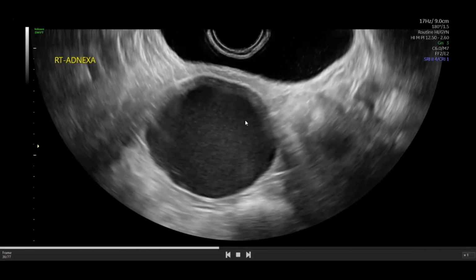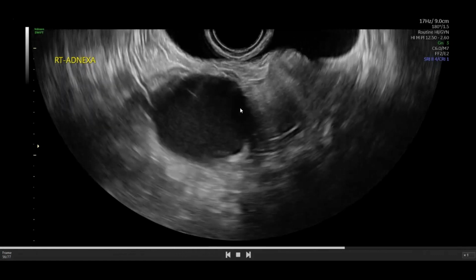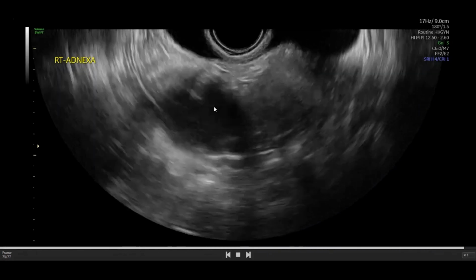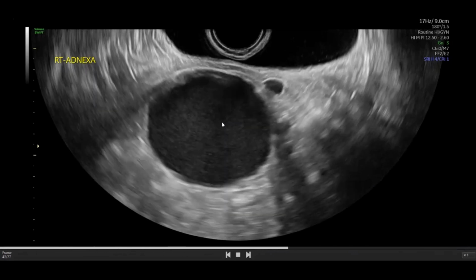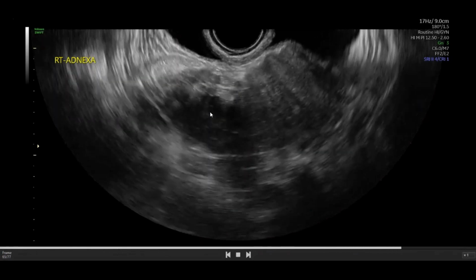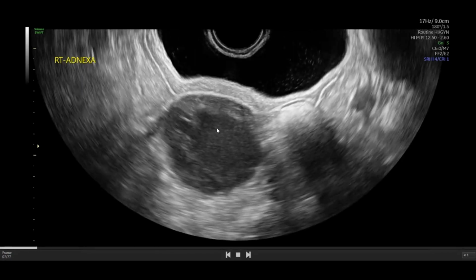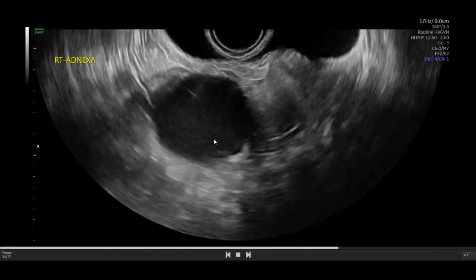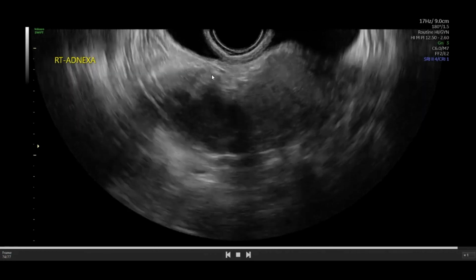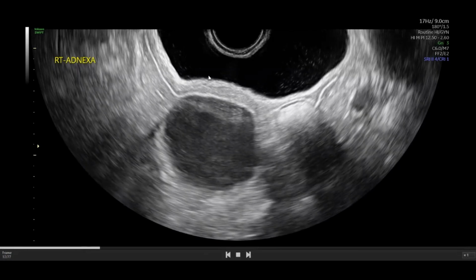And most paratubal cysts don't have contents that have really much substance. They're generally quite serous in nature. They're not like endometriomas, though if you were to absolutely apply the IOTA benign descriptors or easy descriptors to this, you actually might say that based on that, this is an endometrioma. However, we know that this is not part of the ovary. Endometriomas don't exist in isolation outside of the ovary, and they're definitely not paratubal in nature. So I don't think this is an endometrioma. Also, it's not the story that we're being told here, so it's less likely to be the case.